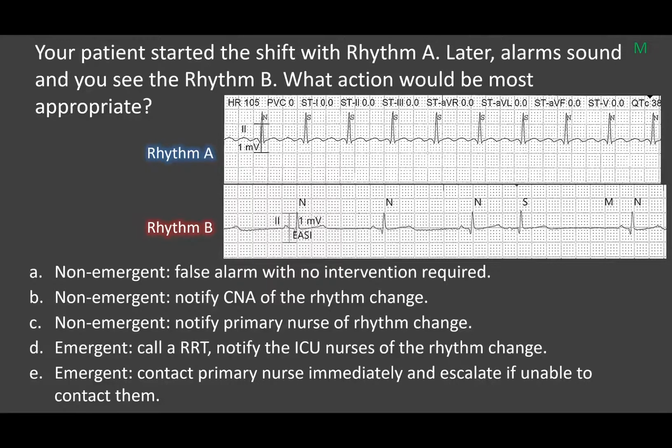Your patient started the shift with rhythm A. Later on, the alarm sounds and you see rhythm B. What action would be most appropriate? And so for monitor techs, what are we going to do? Well, does this appear to be a false alarm? Nope, not at all. Is this an emergent change? Well, you really have to figure out what your rhythm is.